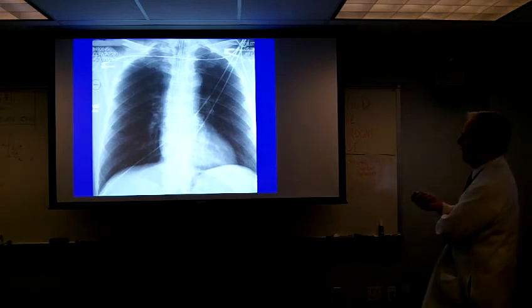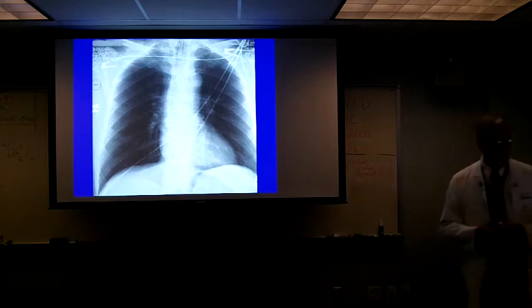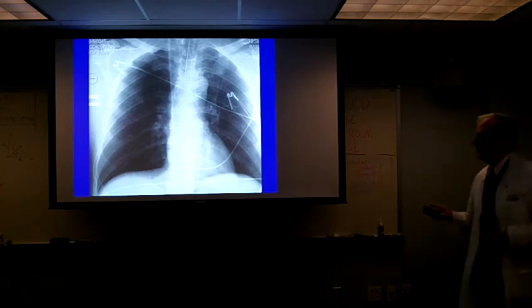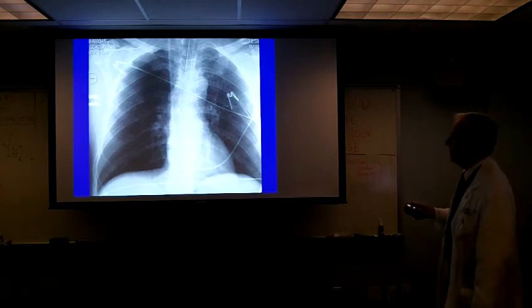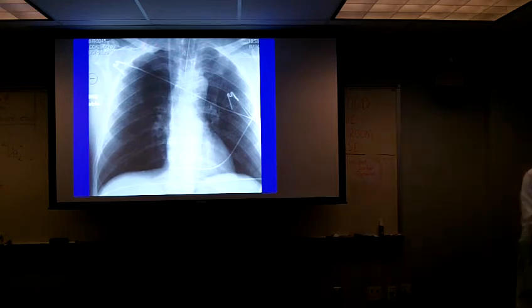This is a baseline film on a patient in the medical intensive care unit. They're intubated, they've got this gastric tube down, and the next day they have a dialysis catheter in place. But there's a little subtle change up here at the right apex. Let's back up one.